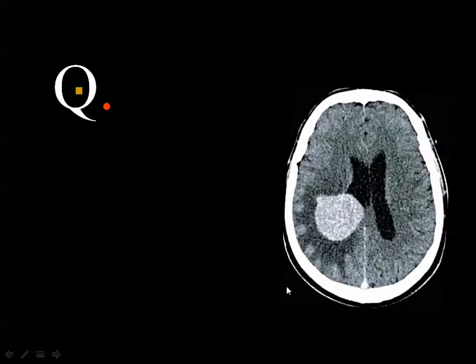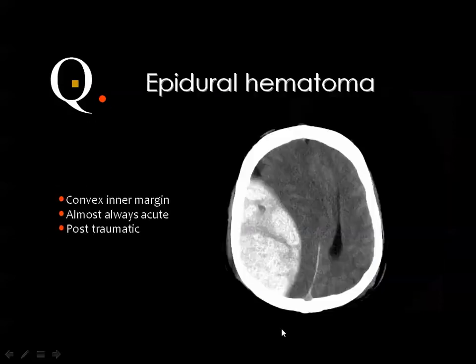If you want to know, you look to the vessels. Like in this case, if you want to know if the patient is injected with contrast, you will see enhancement of the superior sagittal sinus. Here, you do not see enhancement. This is the density of the falx. And with contrast, you may see also some of the vessels enhancing on the cortical surface of the brain. And it should be written, of course, on the film if this patient is injected with contrast or not.